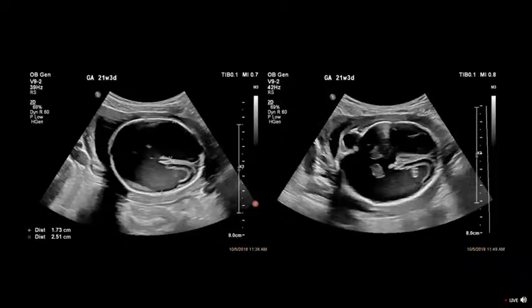So probably it's a bleed. Why would a baby have a bleed in utero? I wish I knew exactly, but this is a super unusual diagnosis. Does anybody have the actual term, the name for this?